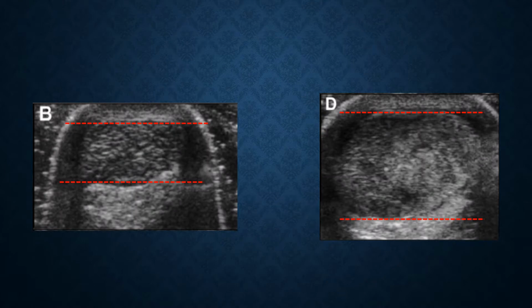I drew red dotted lines on each image to show the margins of the Achilles tendon. The image on the left is of a normal Achilles tendon displaying characteristics that we've seen previously, a more rectangular shape overall with smooth horizontal parallel fibers. The image on the right reveals tendinopathy, where we can see an increase in the cross-sectional area of the tendon, making this portion of the Achilles appear very circular and outside the typical medial-lateral margins.